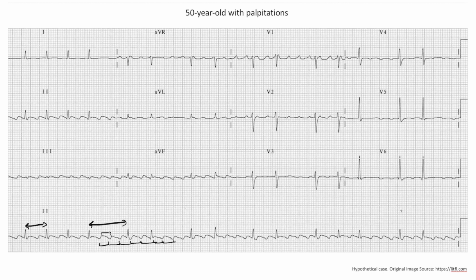Notice that the duration of time between these waves is approximately equal to 300. And when you see this, it's typically characteristic of atrial flutter. Another thing with atrial flutter is that usually some of the waves are blocked off at the level of the AV node, and so not every wave goes through.